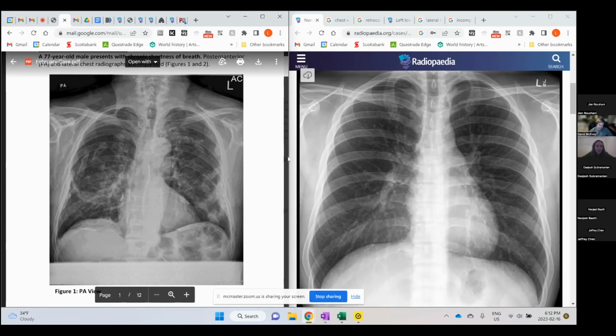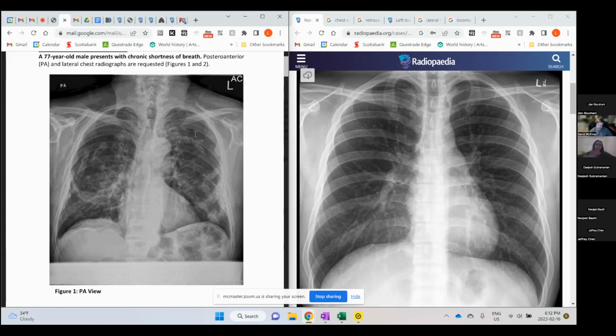I would say multifocal as opposed to diffuse, just because I think it's a bit more specific. Because diffuse might imply that it's everywhere uniformly, like pulmonary edema, for example. But I think multifocal captures that there are multiple lesions better. Yeah, the shape description was also accurate.